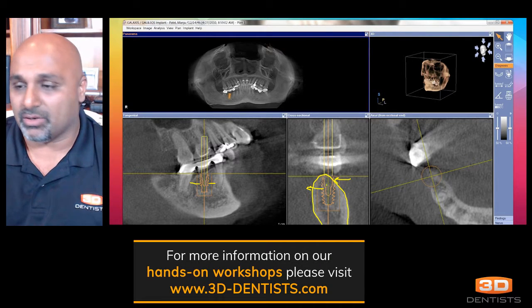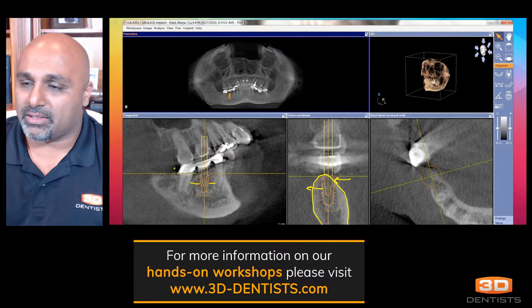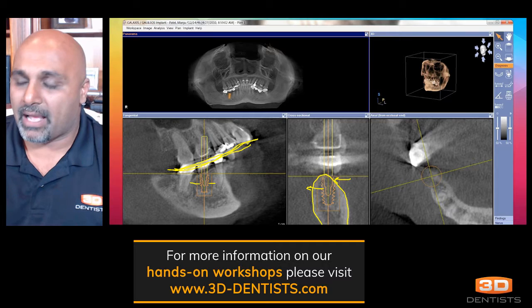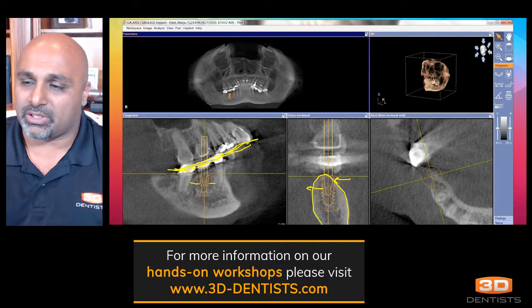But really what I'd like to draw your attention to is that this plane is going like this. And what we do know is that in a perfect world, our occlusion should be going down the long axis of our implant.